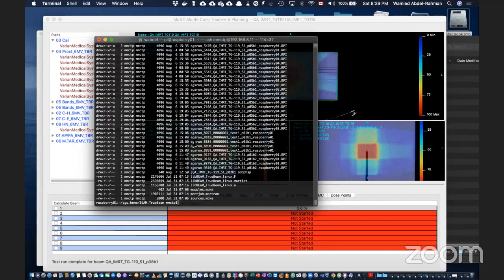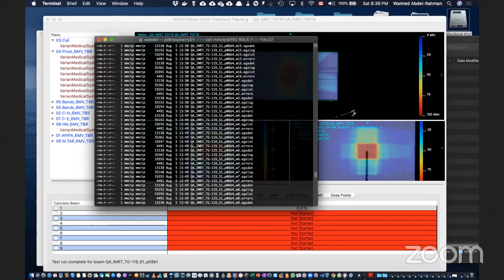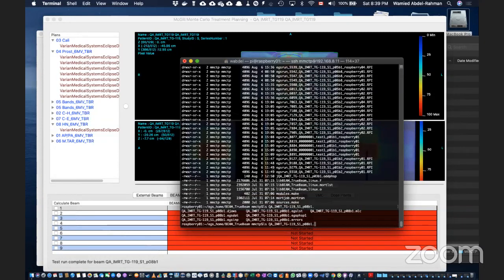Okay, these are the jobs. XRun. I have a lot of stuff here that I was running. Okay, so this is for plan 8. So let's look at CD QA plan 8, and I have only one field. See, there are 2 files here. One is called the DJAWS, and one is called the MLC.